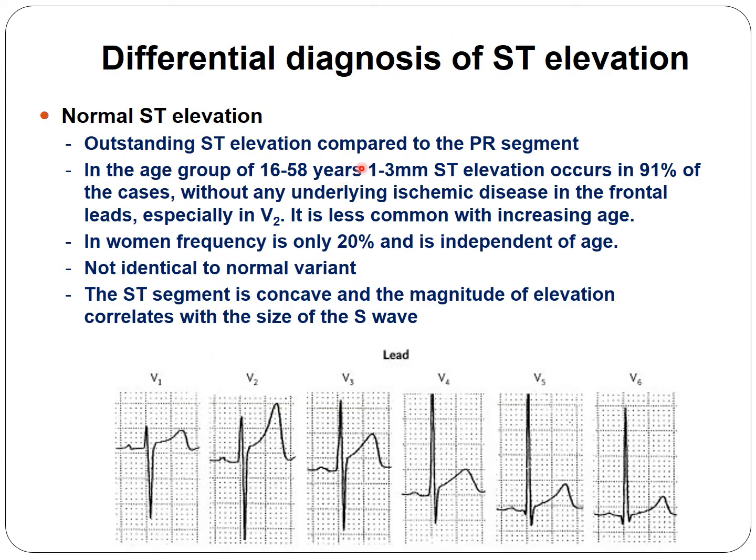The differential diagnosis of the ST elevation. We do have several situations when the ST segment is altered. A very important one, the normal ST elevation. Normal ST elevation can be seen especially when we compare the ST elevation to the PQ or PR segment.